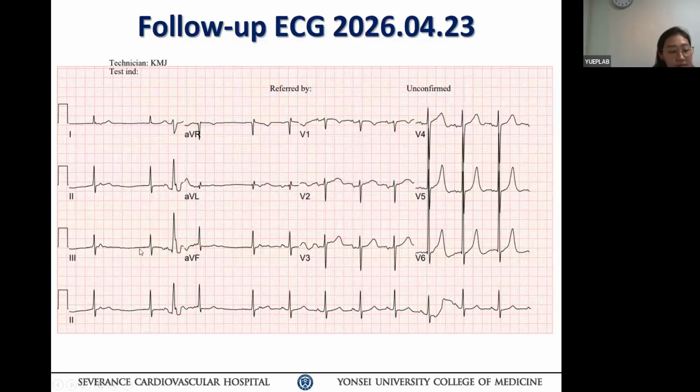So is there any other possibility, that the junctional rhythm, the narrow QRS that looks like junctional rhythm, is preceded by very, very low voltage sinus rhythm after Maze surgery, and a small P wave preceded by the first junctional-like narrow QRS reset the sinus node and also induced the slow atrial tachycardia?